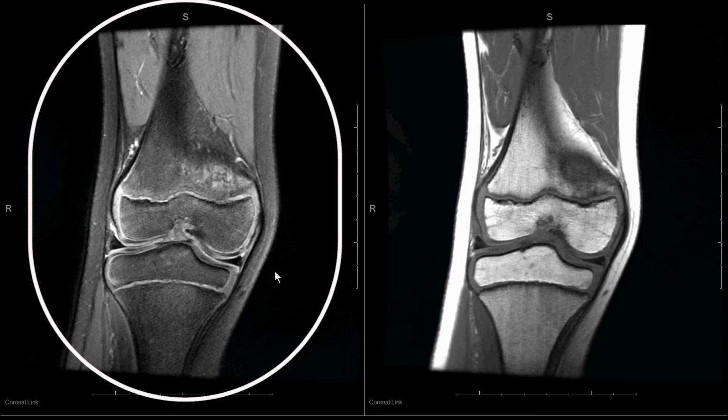A full disruption of the medial collateral ligament is a grade 3, and it will look retracted, thickened, high in signal intensity, and be surrounded by variable amounts of edema, because usually these kids with severe valgus strain are going to have a lot of surrounding edema because of associated tears of other soft tissue structures.